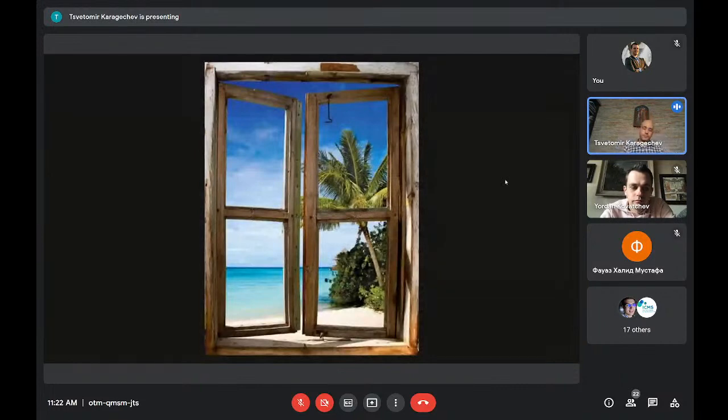So the next, and I really promise the last technical concept that we're going to review today, is windowing. This is basically the way we present our images, the way we present all of these shades of gray.